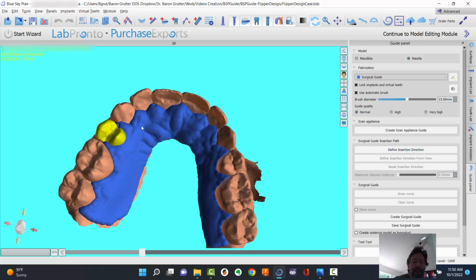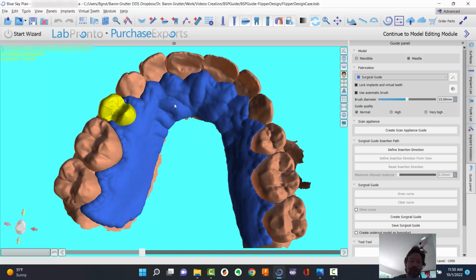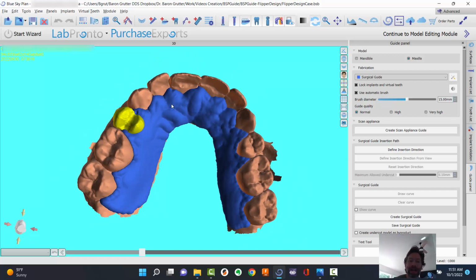But here you go. Again, what did I do that was additional work? Well, I had to cut out the tooth. I didn't delete the old tooth, and I healed the bottom of it. Okay, that takes all of 2 seconds to press the button twice as opposed to just once for the model. Once for the model, once for the tooth. I duplicated the model a couple times and renamed it. Okay, let's say 30 seconds for duplicating some models here and there. And lastly, I drew a new surgical guide for this, which takes a minute to draw that outline and click that button. And then lastly, I just smooth out the areas that were high occlusion. So again, I think 2 minutes is a high estimation.